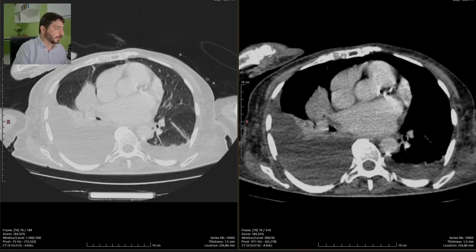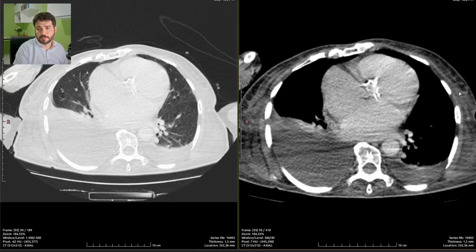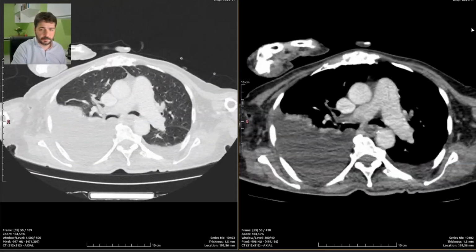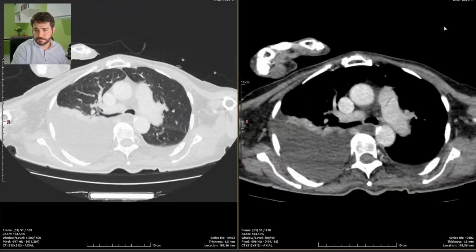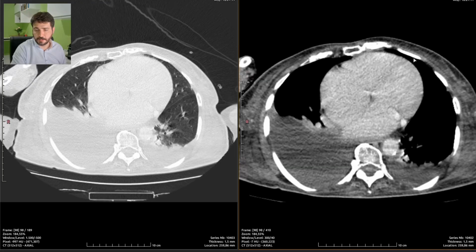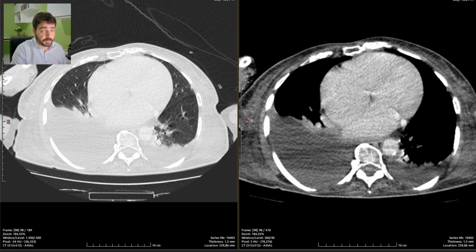pulmonary lobe. Let's see, there is calcification of the aorta and the coronary vessels. The heart is very, very enlarged. What else? Are there lymph node enlargements? No lymph node enlargement, just a distended esophagus. Liquid distension with air fluid levels on the esophagus. And this is it. Let's just summarize this report to make it easier for reading by the referring physician.